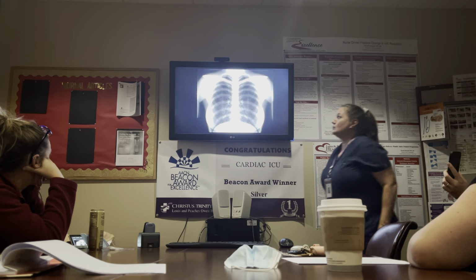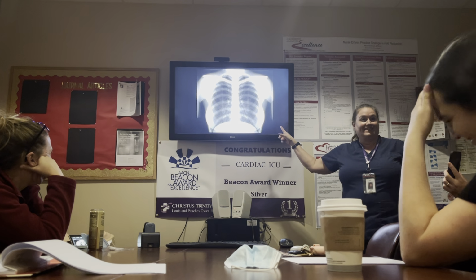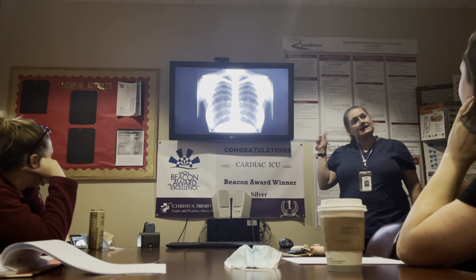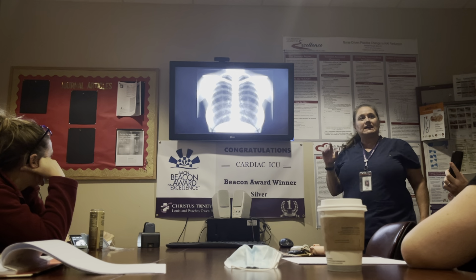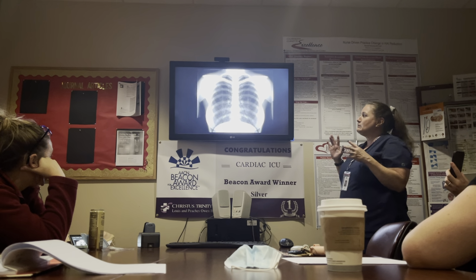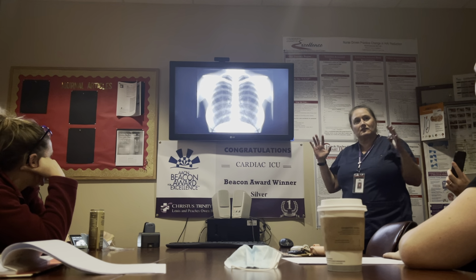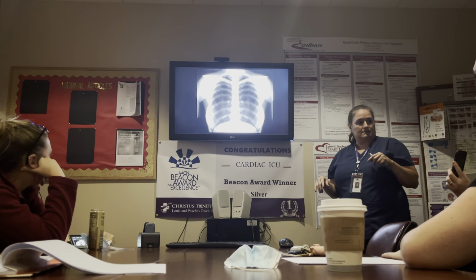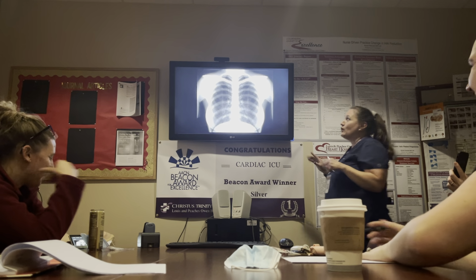What's this? Where's the heart? This is an asthmatic patient in extremis, and the heart almost disappears. It's actually compressed that much because the lungs are so ballooned out. What this patient needs is for us to stop them from breathing as badly as they are, and their silhouette will come back. The heart has not been taken out. It's just taken over by the lungs.